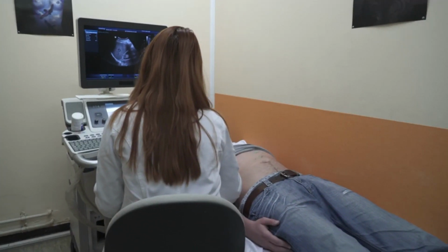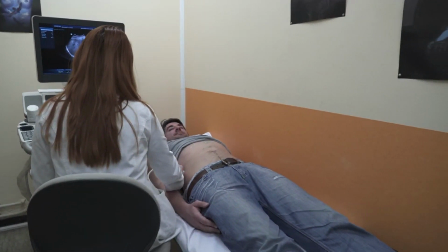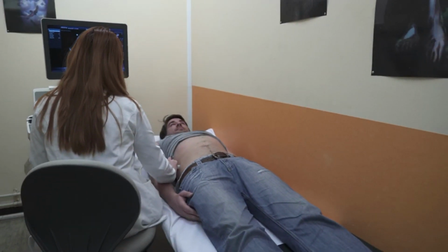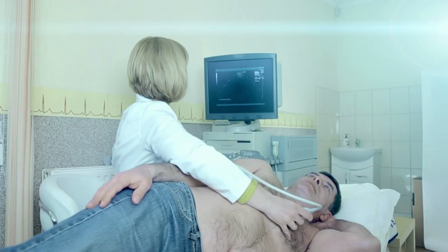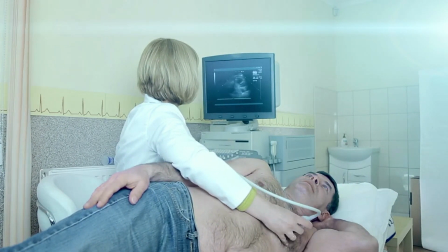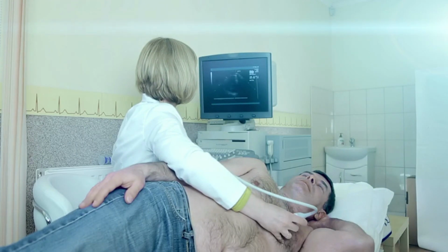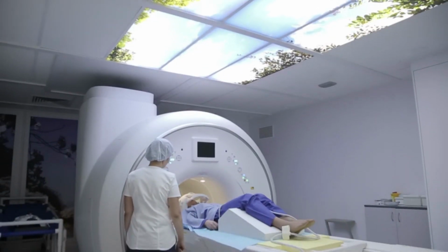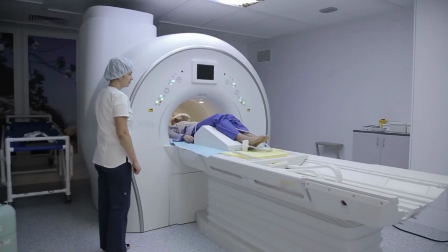Ultrasounds are the opposite of X-rays in the sense that they are worse at looking at bones, are better at looking at soft tissue organs, and use no radiation, so have no risk of radiation harm. Ultrasounds get real-time images including motion, so are often preferred for looking at the heart beating, in which case they are called echocardiograms.